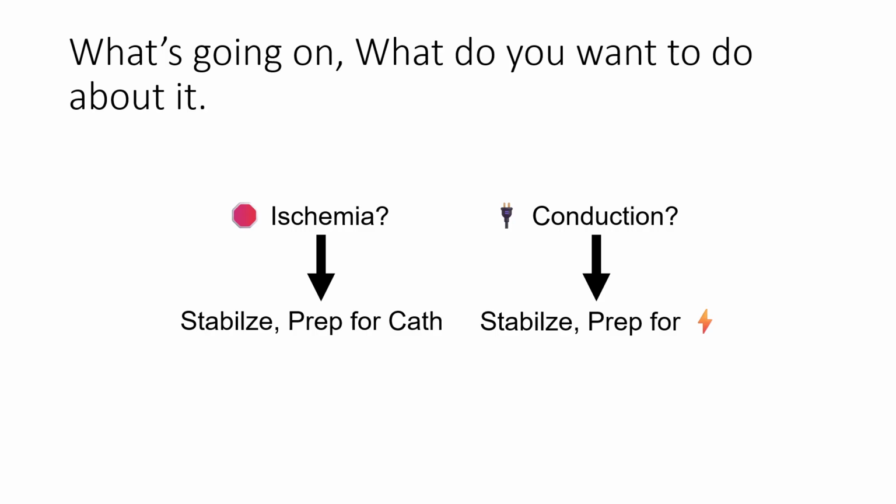This patient needs to go to the cath lab, but we also need to be ready to pace the patient, use vasopressors, or all of the above. This is why it helps to be systematic, to not get distracted by one feature before looking at the others. At a minimum, I think that your system should involve you confirming related P's first before looking for other stuff. Then get in the habit of looking at ECGs in a way that ensures that you look at all the leads.